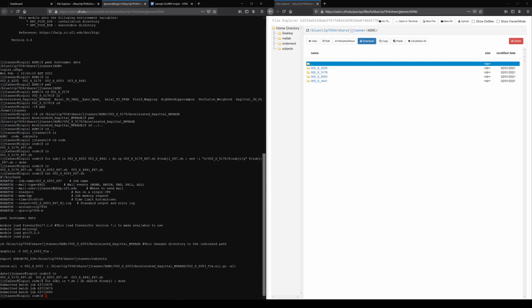If you have to do more than 1,000, I don't remember the cutoff limit. The HiPerGator team says don't do this if you're doing thousands and thousands, but a few of them or some hundreds, it's okay. But that should be submitted. Now we'll see if that's running.